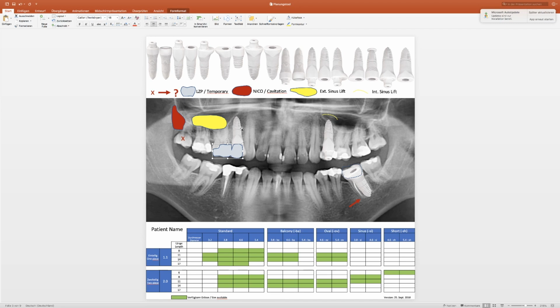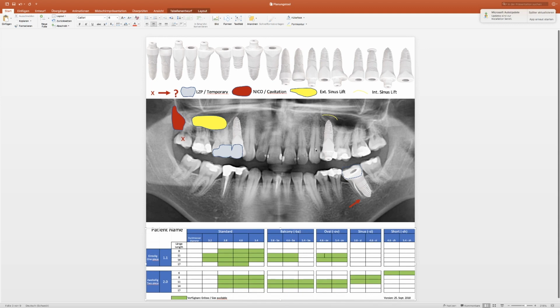The implants I select, in this case here, 4.6 oval one piece. So I select here one piece oval 4.6. In this case I need 2 of them. So I plan 2 as an alternative. I also plan the same in 14 millimeters. Down here a 2-piece implant.